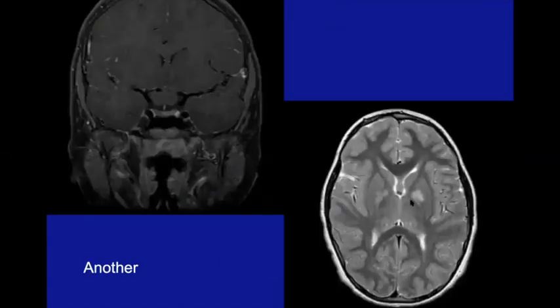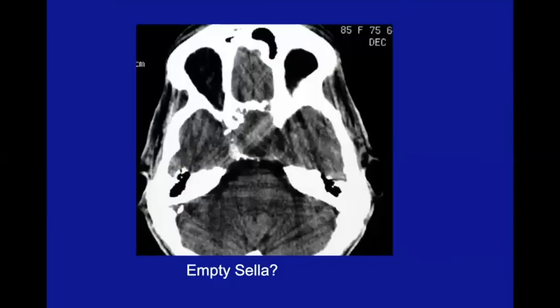Here again, this is a different patient, sort of same disease, and you see this enlargement of the optic chiasm, and you see these other spots in the brain. Of course, if you're fastidious about looking at the history, you might know the patient has NF1. So again, this is a normal appearance or a typical appearance of an optic glioma in a patient with neurofibromatosis type 1.